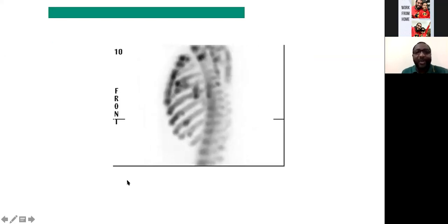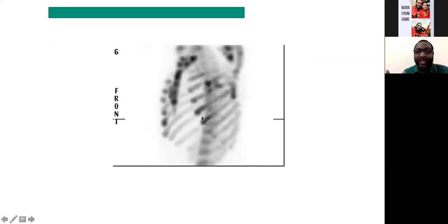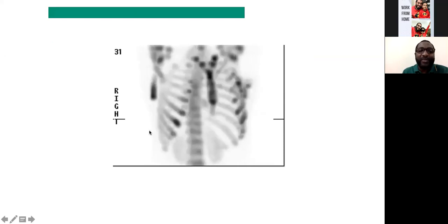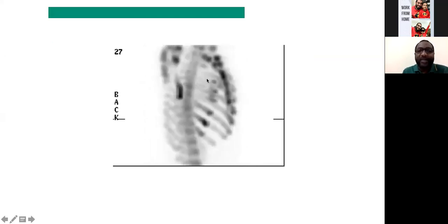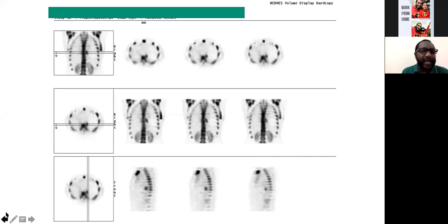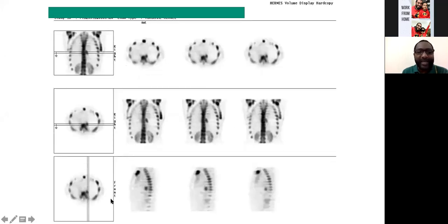Now, we also have a tomographic image. A tomographic image is usually a three-dimensional image. Again, the idea of this is a rotational maximum intensity projection image. It's also called a MIP image. And this essentially will be able to show you the rotation of the patient, and you'll be able to see if there are overlying structures. If you are unable to do a SPECT CT in a patient, sometimes you can do a tomography of a particular region of the body in order to properly visualize lesions, or in order to differentiate lesions from underlying structures. Again, the tomographic view can be either in rotation form in this three-dimensional view, or they can be displayed as various images, as short static images, a series of images.